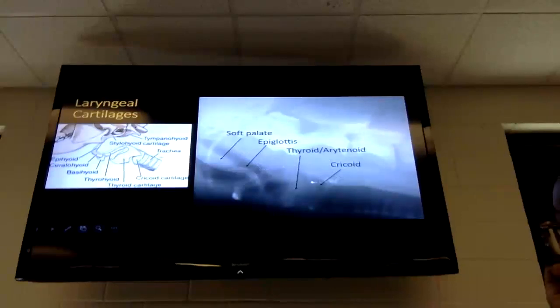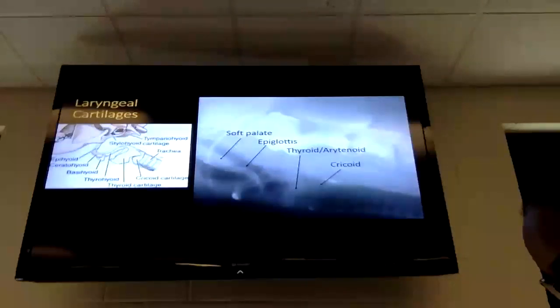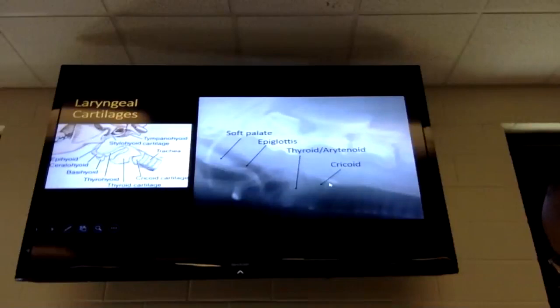So for example, over here, you can identify the bones, right? So this would be thyrohyoid bone, and then that connects with the thyroid cartilage. Arytenoid is also in this opacity, but you cannot identify them separately because they are superimposed. Further to that would be cricoid. This triangular-like structure would be the cricoid cartilage of larynx. And if there is mineralization of larynx that happens with old age, you may see increase of these cartilages, and that's normal if it is an older dog. Okay.